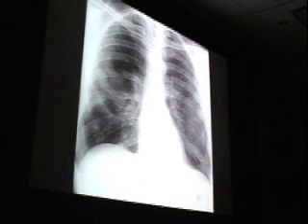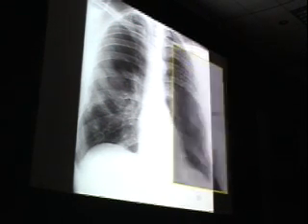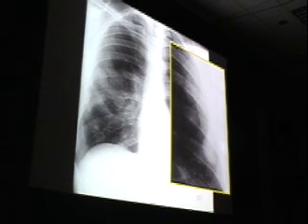The next most common thing to see is shown here, which are pleural plaques without calcification. And again, you can tend to see these things along the pleura, usually in the mid and lower lung zones, as shown here. You can see them very well. These are pleural plaques, and they are caused because the asbestos fiber actually pokes through the visceral pleura.